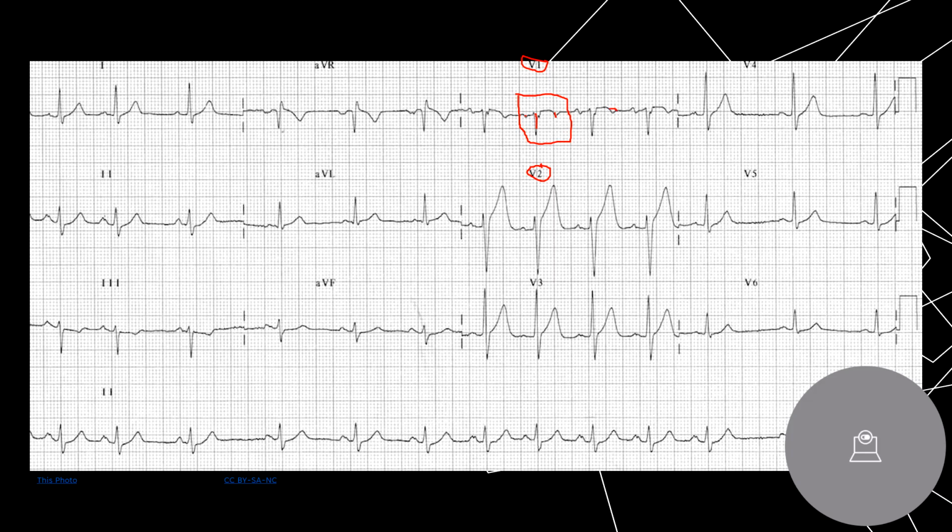This is the T wave. You actually have here to here. That's a little slanted, possibly a little elevation in V1. Look at V2 though. So V2, and again, I'm not going into bundle branch blocks, so we're not going to go down that road today. But this is a P wave right here. This is a QRS. And this is a T wave. This is the T right here.